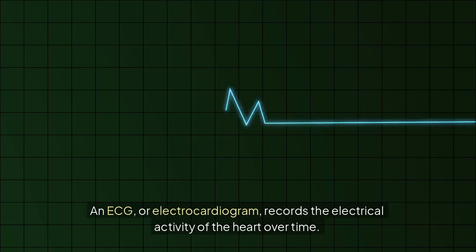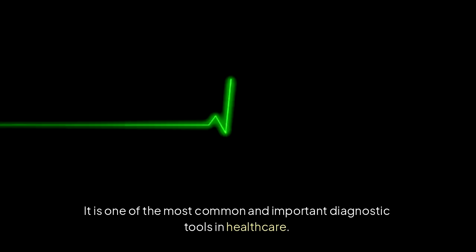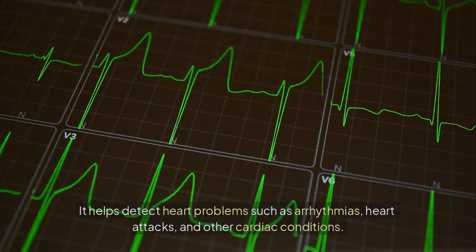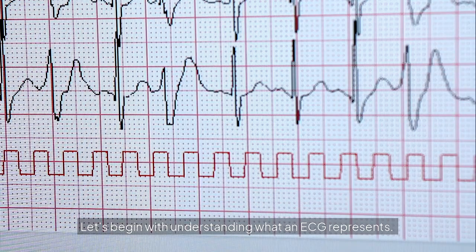An ECG, or electrocardiogram, records the electrical activity of the heart over time. It is one of the most common and important diagnostic tools in healthcare. It helps detect heart problems such as arrhythmias, heart attacks, and other cardiac conditions. Let's begin with understanding what an ECG represents.